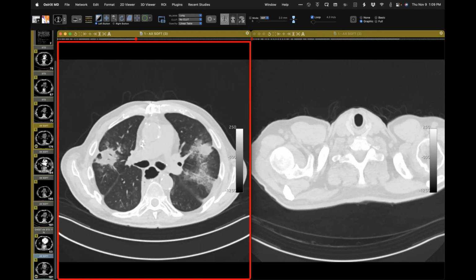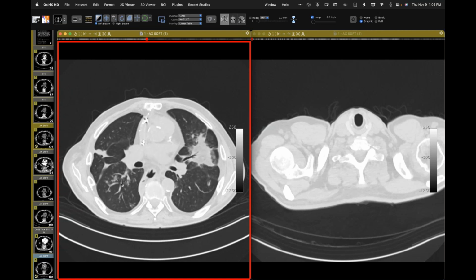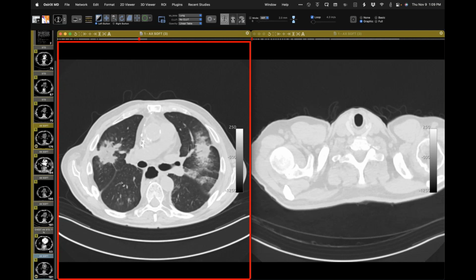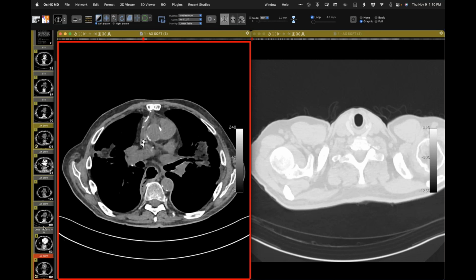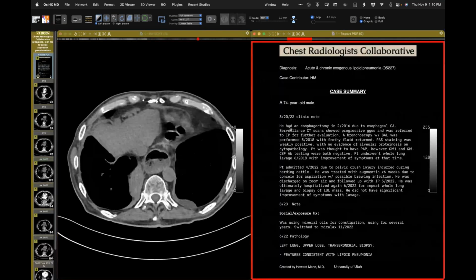This kind of appearance to the opacity is rather typical. There's a tremendous granulomatous response. These begin over time, of course, to look very mass-like when they're solitary. One can see how a diagnosis of malignancy might be entertained. But look here how low attenuation we have in the center. So there's a lot of fat in that location. And eventually they did get that history of regular mineral oil use right here.